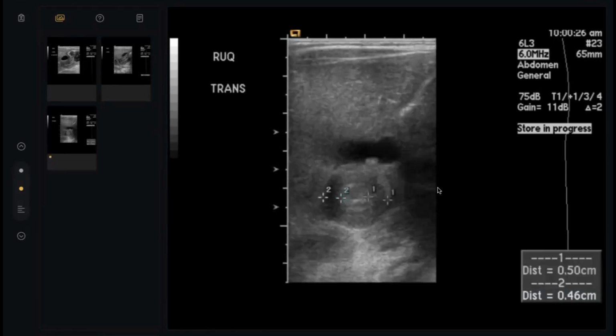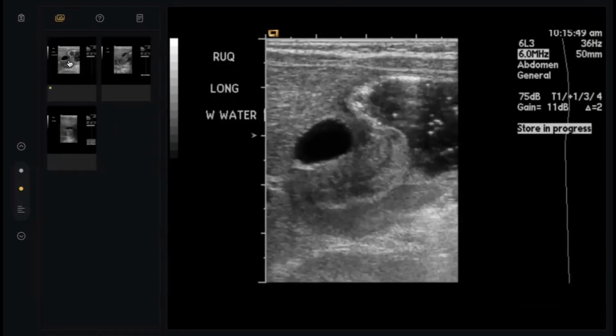But what about this one? What is the normal? This is one limb of the muscle. It should be less than 4 millimeter. Some books say 3. Okay, 4 or 3. So, what is your final diagnosis? My final diagnosis is hypertrophic pyloric stenosis. Congenital hypertrophic pyloric stenosis. Thank you, doctor, so much.